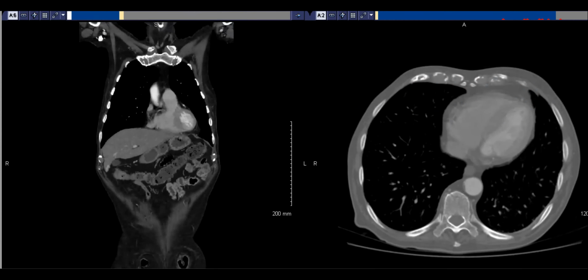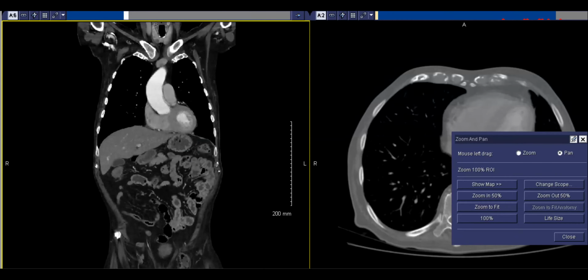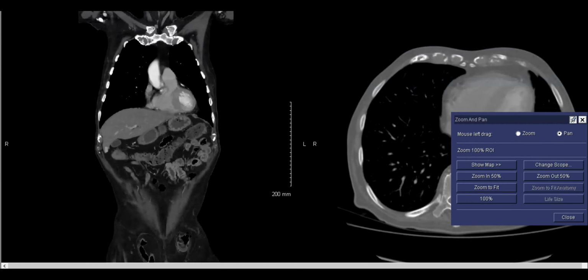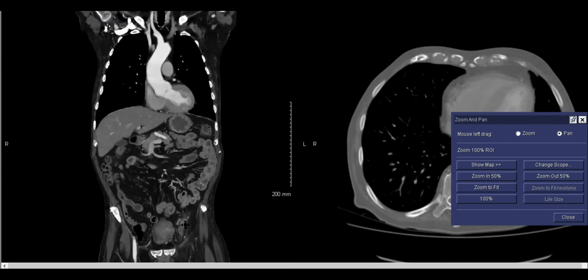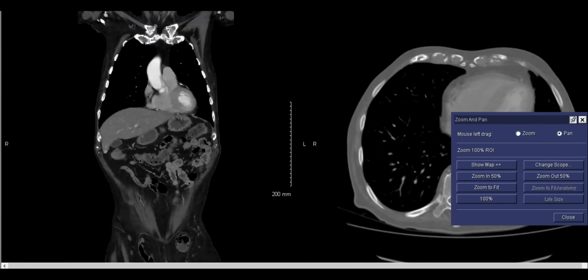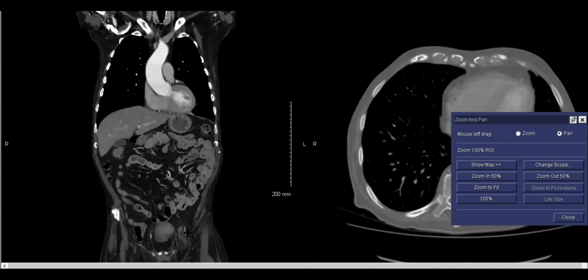And let me just bring this. Oh, okay, I can't do that. Let me show that. Can you see the bottom? So you can see that there's what looks like a loop, except it's really not a loop, right? There's something connecting to the sigmoid that comes down and then forms this thing, and it has air and fluid. It totally looks like a loop.